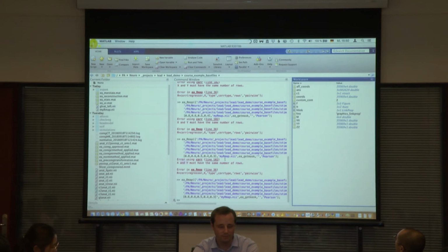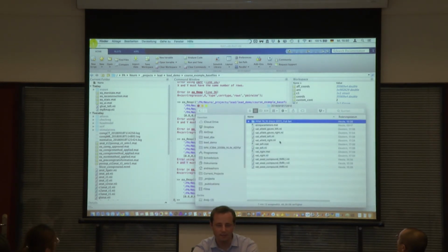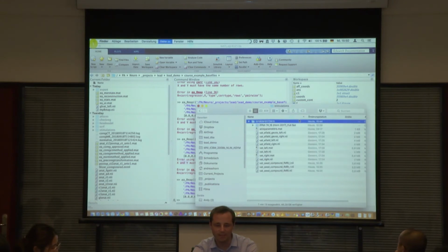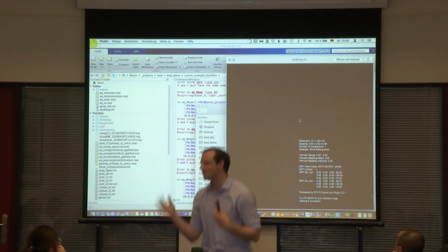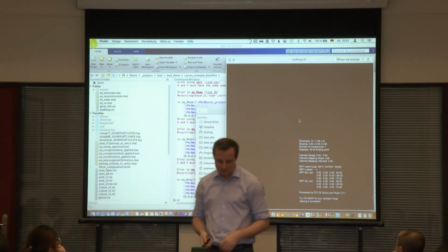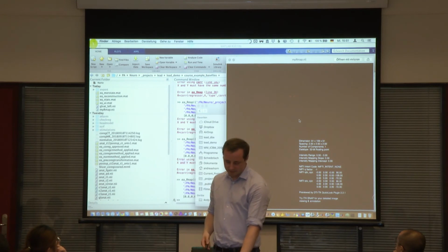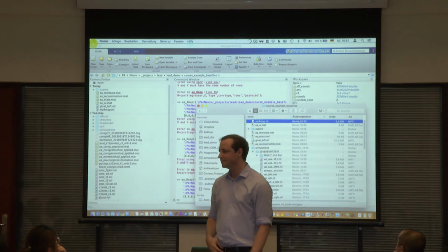Right. So now, I can send you this text file if you want. And we have now created a fake RMAP that doesn't work because it's always the same image and we have different values, so all correlations I think will be 0. But yeah, that would do that.